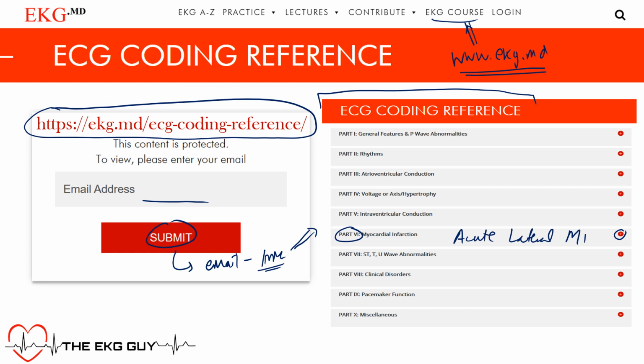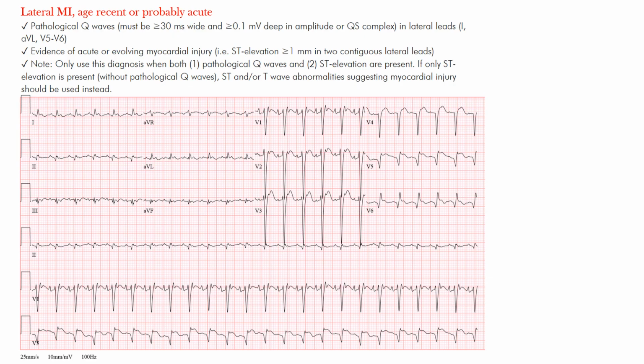All right, so let's get started. So acute lateral MI, or this lateral MI that's age recent, meaning happened recently or probably acute. So pretty much an acute lateral MI. What are the findings we expect?